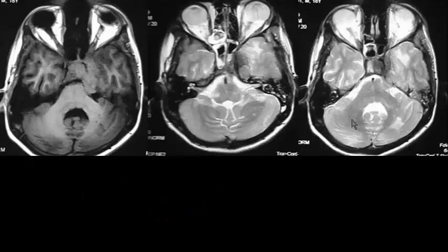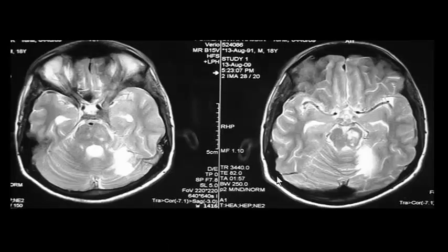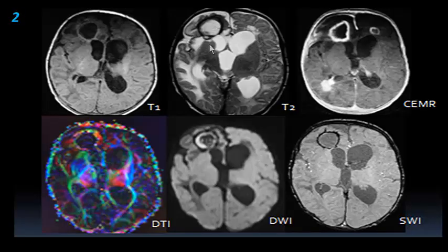In mucor also, usually the clinical setting is that of diabetes, and one of the paranasal infections spreads into the brain in the form of a large enhancement in the cavernous sinus area as well as in the suprasellar region. Just let me show you two examples of fungal abscess, how they look.